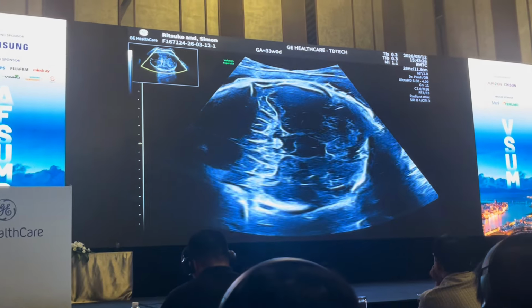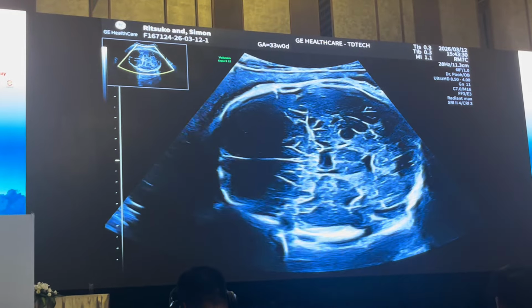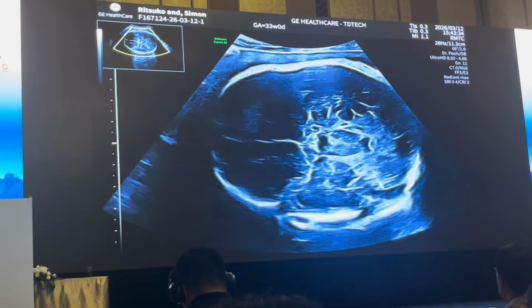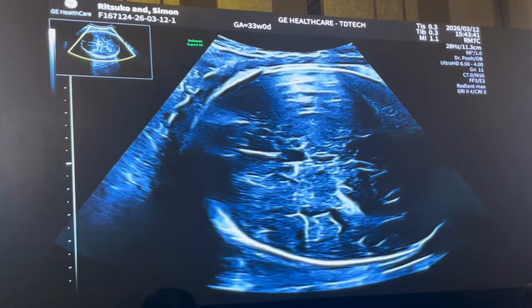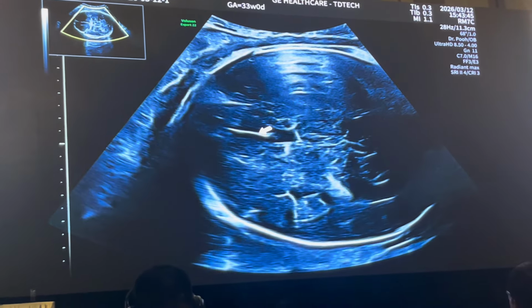Anterior complex is there, right? Correct, and I think it's a very important point to make, in the sense when you're faced with that situation early in the trimester, if you can't see the CSP, don't jump to a diagnosis. Just go ahead and evaluate the anterior complex. And just to point the landmarks of the anterior complex, this is the midline falx.